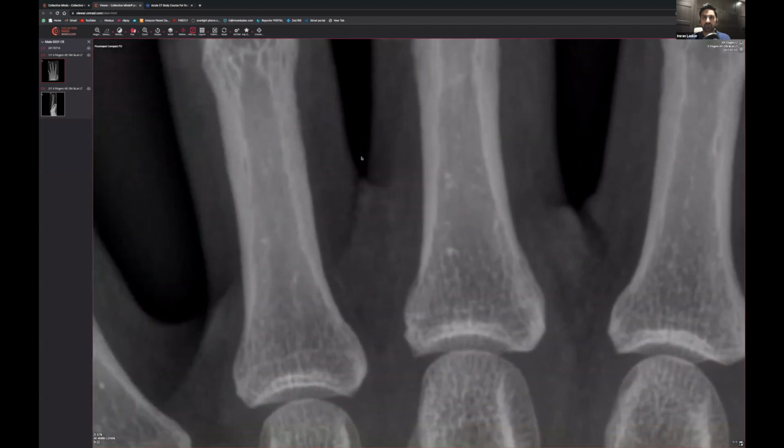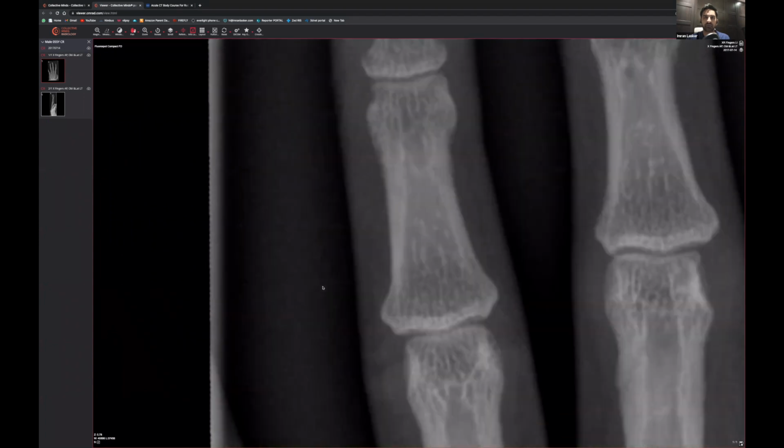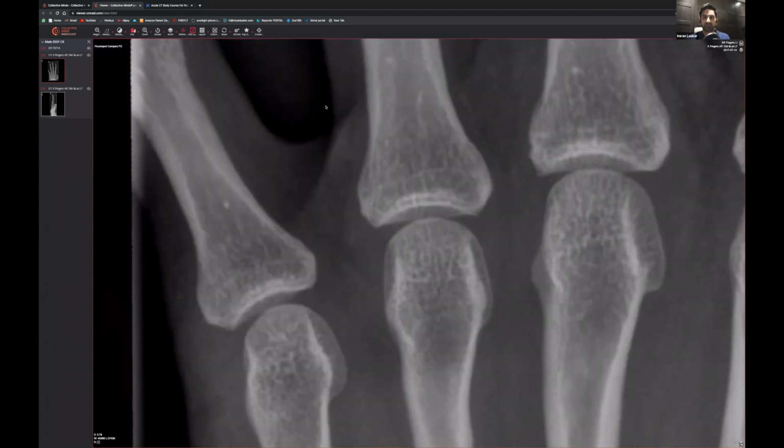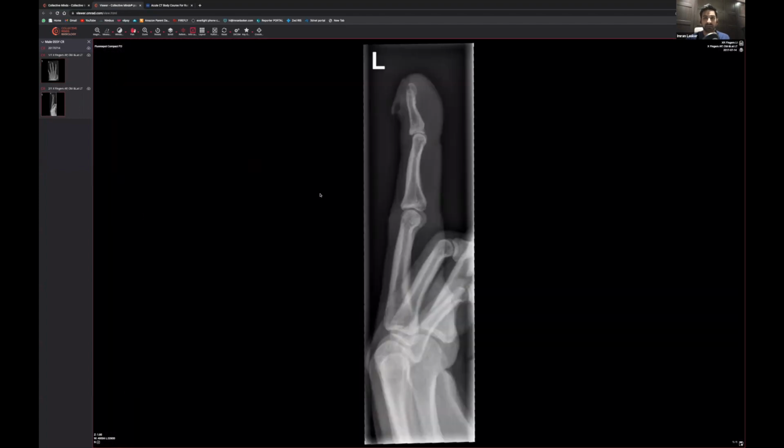and just make sure that all the bones are fine. And this is genuinely what you do when you're looking at these X-rays, you just got to make sure that there is no evidence of any other fractures, because like I keep saying, and I've always said on all these talks, the second fracture is usually the fracture that gets missed the most.